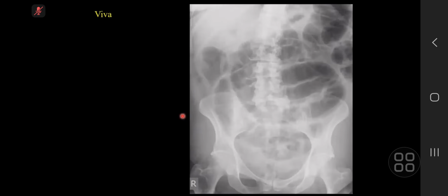Okay, so there is small bowel obstruction with dilated loops of centrally placed bowel, and there are some shadows projected over the liver, in keeping with portal venous gas. And there are some on the left-hand side. There's also some air between bowel loops, so likely to be some pneumatosis as well.